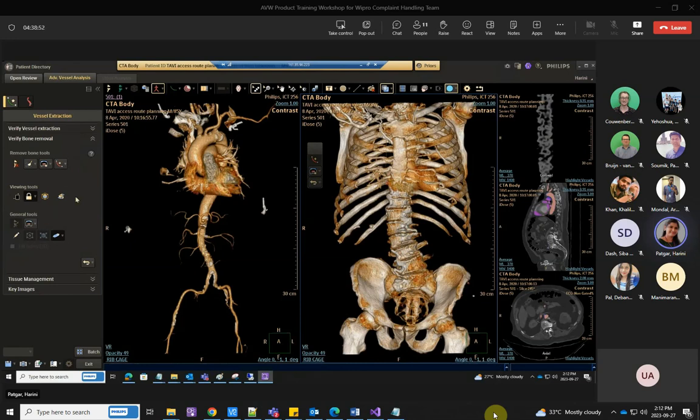And these tools are common across. From viewing we take, like bounding, this and all, it works for the volume, and it is not that much into the application. But yeah, which radiologists will anyway use. But at a high level, I'm just taking you through what this tissue management is about. Any additional vessels if you have added, that is why it is not coming here.